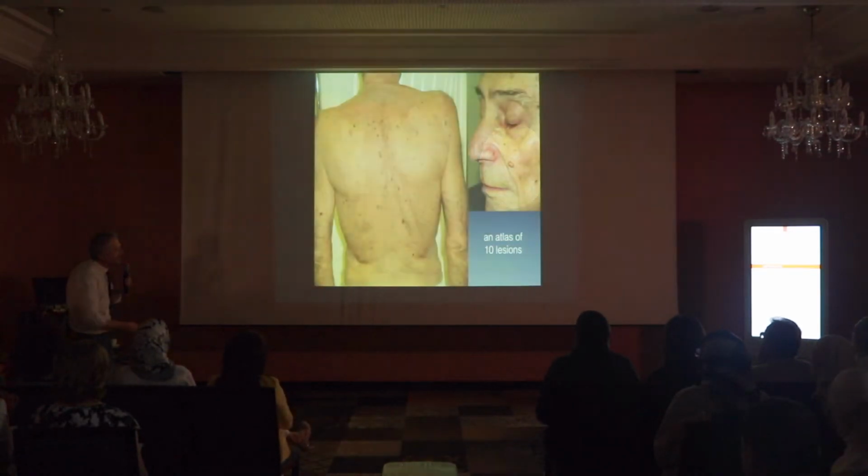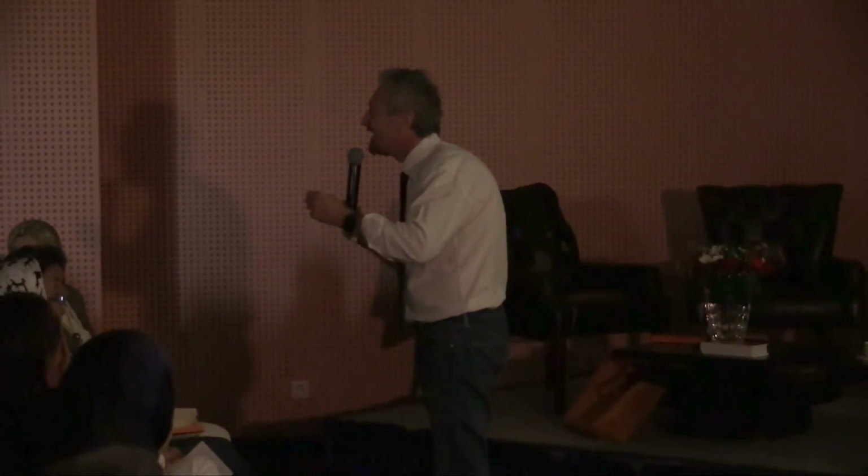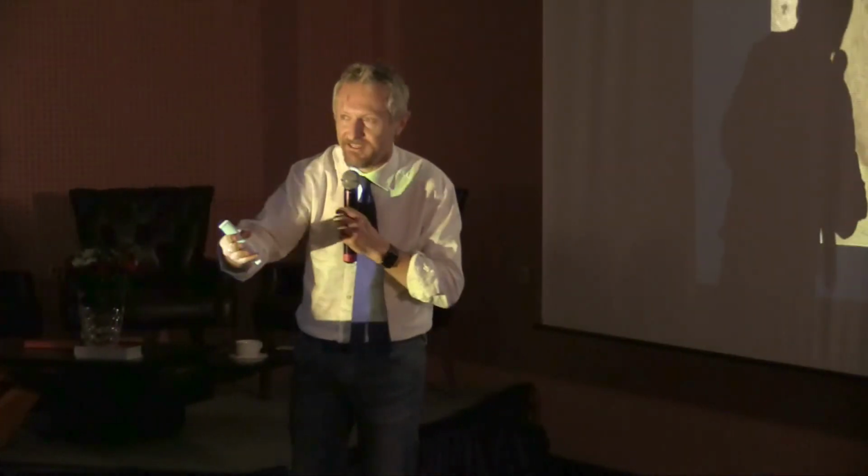Dermal nevus. You know what is the best criterion to diagnose dermal nevus? Comma vessels? No, it's not the best one. Hair, okay, but there is even a better one. Globules, okay, but there is an easier one that you don't realize, but you use every day.